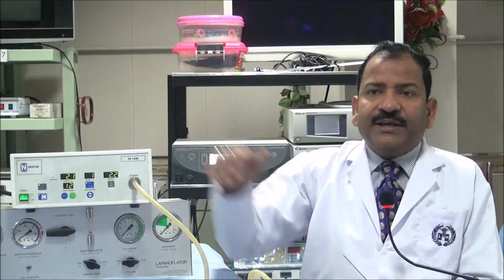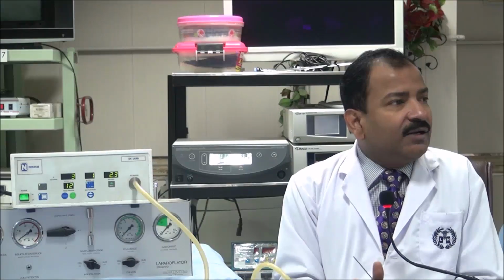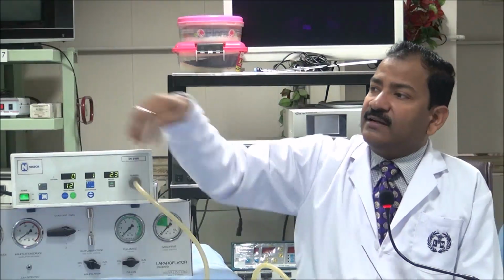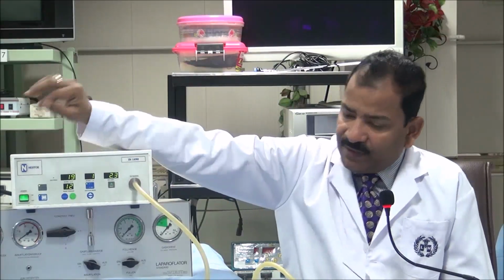But as soon as you attach the Veress needle, this error will come. Sometimes 16, sometimes 18, sometimes 20. Then it's very bad. How can I know where it is? So if you are using the Veress needle, the actual pressure is when the gas is off. When the gas is going, at that time it is a false pressure. When the gas is not going, at that time it is the true pressure, which is sensed by the insufflator. So the actual pressure is the minimum of 5 readings. And what is the minimum here? 0. Can you see that? Yes, sir. Minimum is 0.